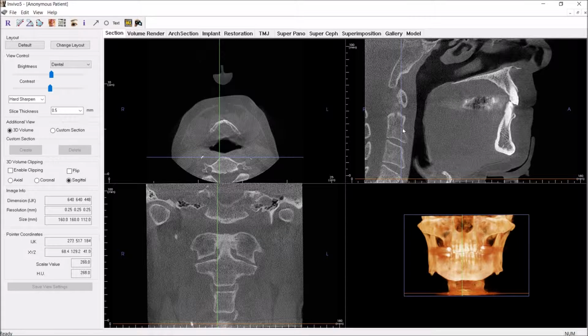And that is just in line with this is 2, so this is 1, 2, 3, 4. That's just at that level, the C3, C4, that's where the carotid artery bifurcates into the internal and external carotid arteries. And that's typically where you start to see that atheroma plaque build up. We'll also see it sometimes up in the internal as it's proceeding through the cranium. You can see calcifications there, and so it's important to remark on.